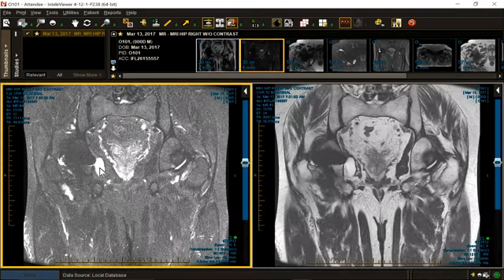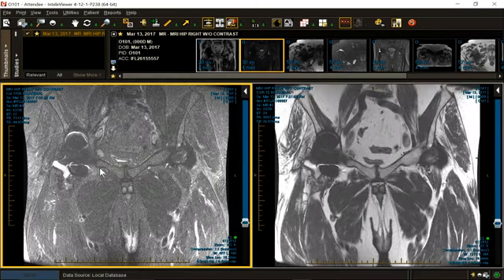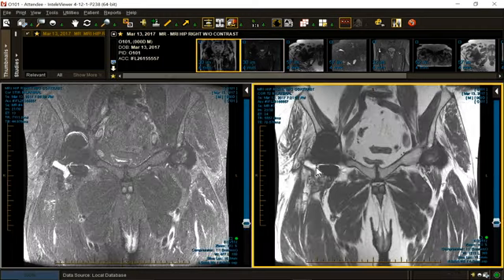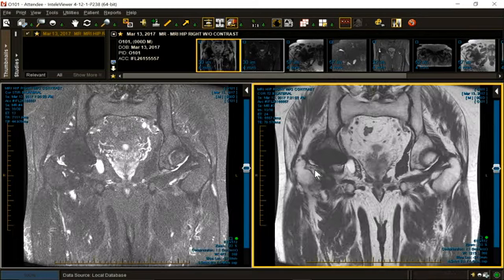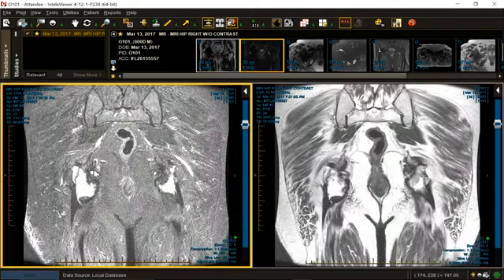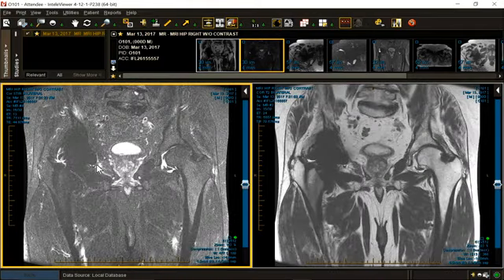On the other hand, if it's metal signal, if it's metal on metal, so-called metallosis, then you will see metallic susceptibility effect, and very dark signal in the effusion. You should not have an effusion after a hip replacement. And the effusions with these reactions are large, like this one. So let's keep looking, shall we?